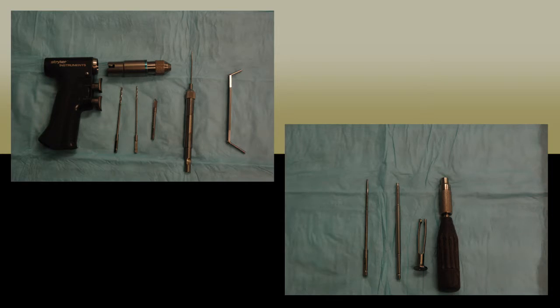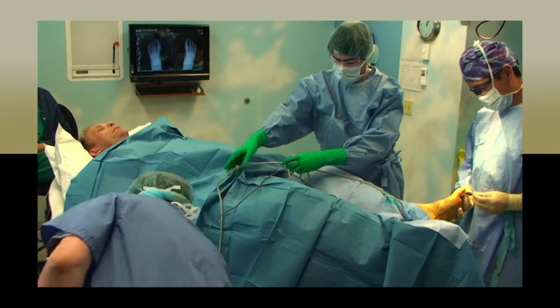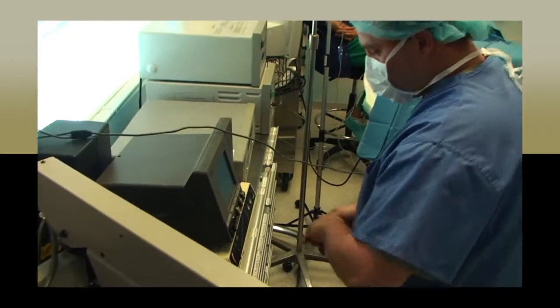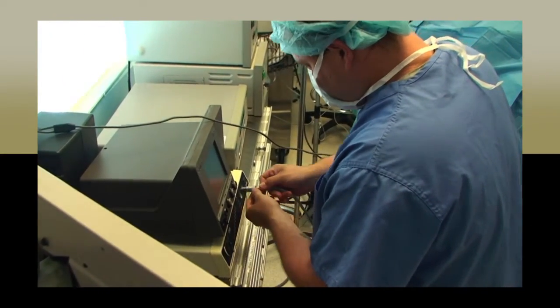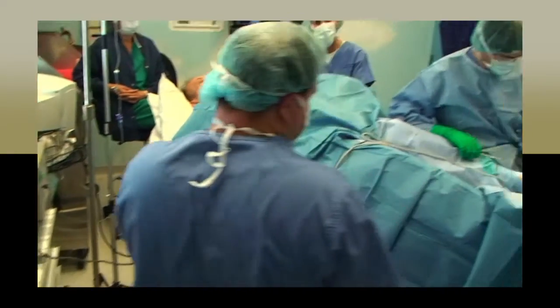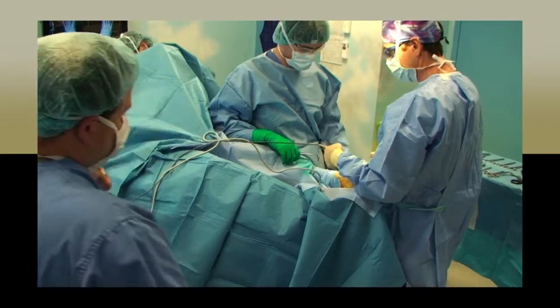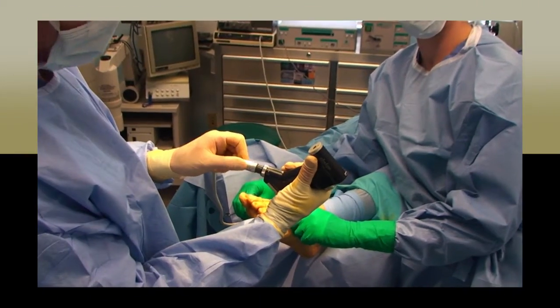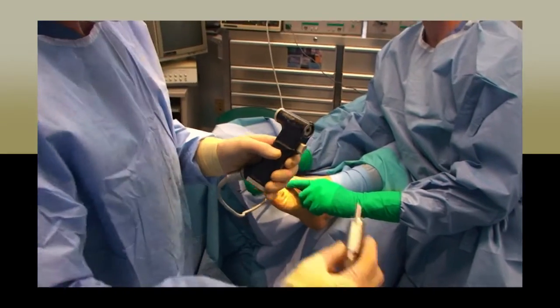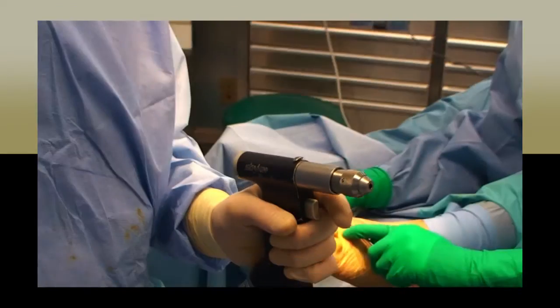To do so, make sure the electrical cord is guided through the drape guides, which are in place to keep the cord from slipping off the sterile field. One end of the power cord must be passed to the circulator to plug it into the power source. The other end will be plugged into the drill power handle. When this is secure, you must place the head of the drill into the handle by following the guides at the edge of the handle and placing the head correctly into the handle.